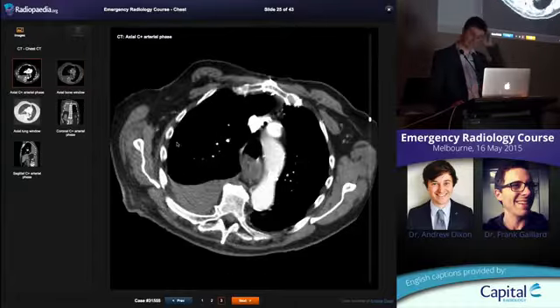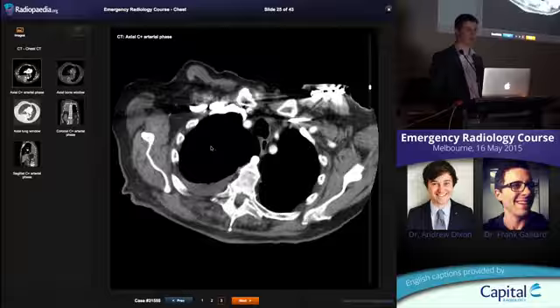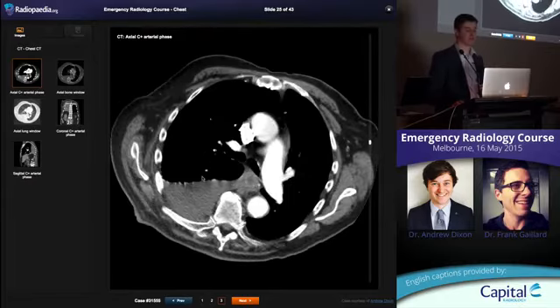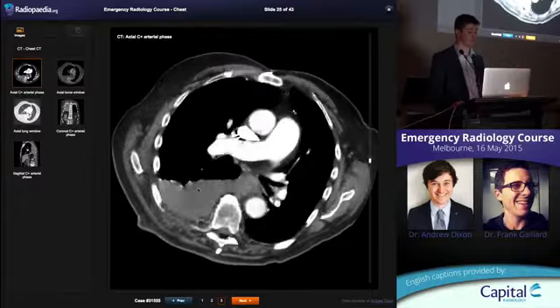One thing I often get asked is how ED guys not knowing the difference between a pleural effusion and atelectasis in the lung. We use the term atelectasis when we're talking about collapse. It's the same as collapse, okay? And the key is that atelectasis is part of the lung. The lung has vessels going through it. It's going to enhance. It's going to have vessels, okay?